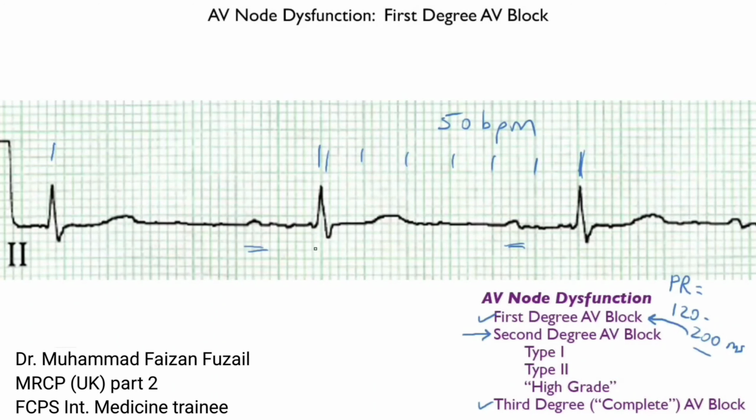Now what's the PR interval? Well, it depends on where the P wave starts. Look for the point where it leaves the baseline, and then the end of the PR interval is where the QRS begins. I just want to show you that this ECG happens to have a fair amount of low-level noise, and these little jiggles here are the noise artifacts that I'm talking about.